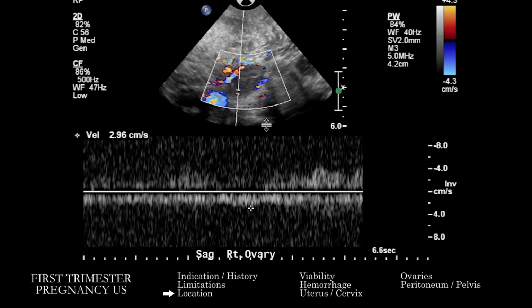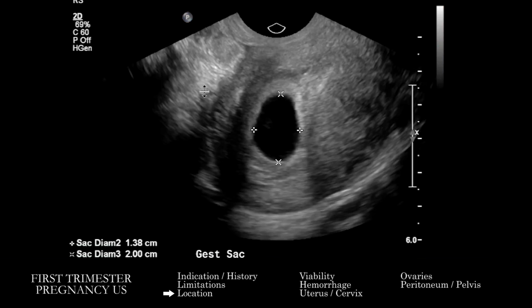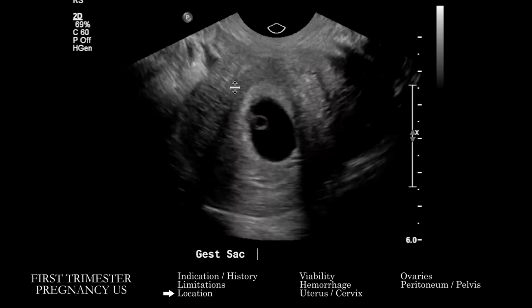So in this particular case, it's very clear that we have an intrauterine pregnancy, but the major important signs to be looking for early on are: is there a cystic structure in or adjacent to the endometrium? Do you see the decidual or double decidual sign? Can you see an actual yolk sac? And here we see it pretty clearly.